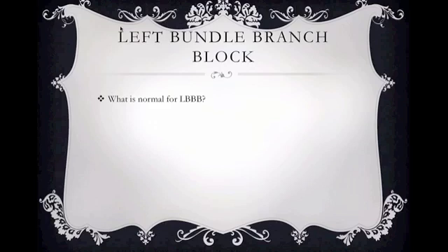Well, left bundle branch block. That is the L of our mnemonic. The bane of every paramedic's existence: a patient with left bundle branch block. We don't have old EKGs to compare. We don't know if this is old or new, so we have to presume that it's new unless the patient is absolutely astute on their diagnosis.